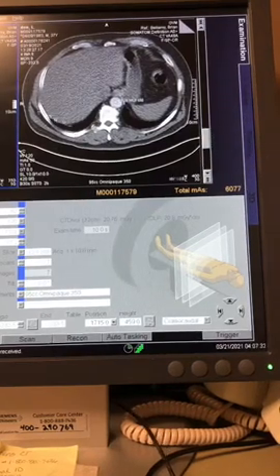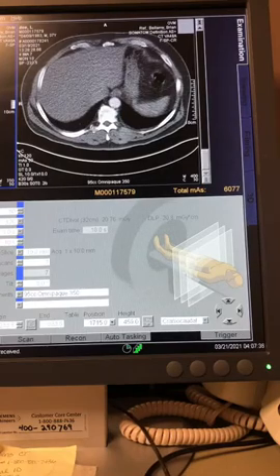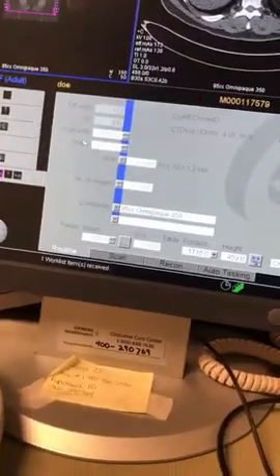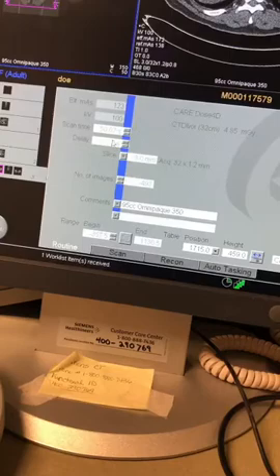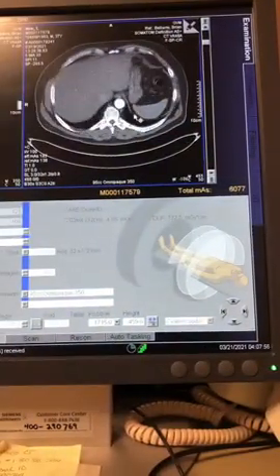At this point, we're looking at, say we got 6 images, and we did 10 seconds, so we're at 16 seconds, and then this is the difference right here. This is the difference between the regular chest and the angio. This is a 3-second countdown instead of a 10-second countdown. All right, so that 7-second difference gives you an aorta that looks this bright.